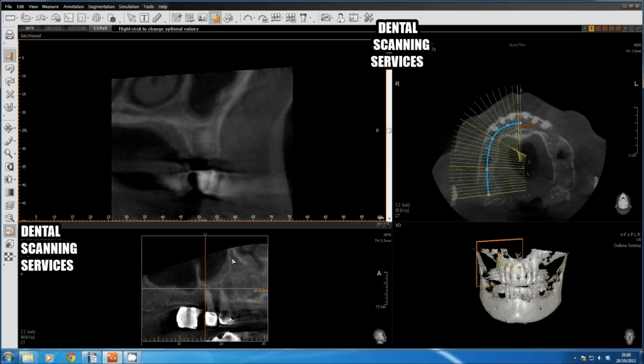You will also notice that there's reasonably well developed thickening of the lining of the sinus here, up and over this septa and then travelling posteriorly, and that's reinforced when you look at the sectional view top left hand side, where we see the outline of the floor of the sinus, and then we see this thick lining underneath.